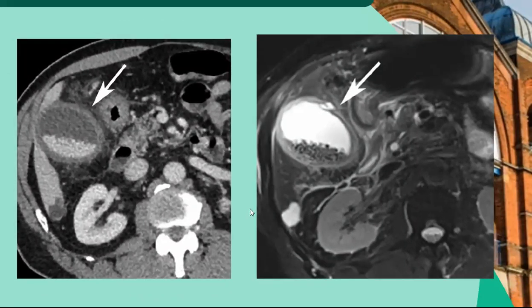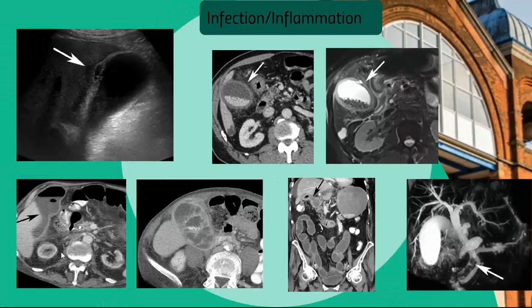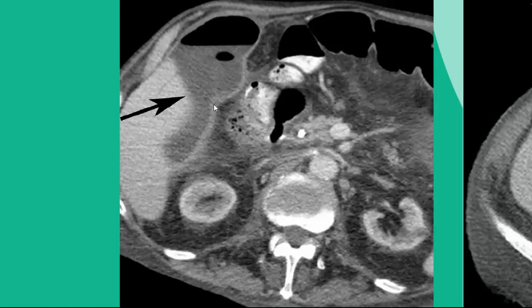Back to acute cholecystitis. This can be complicated by secondary infection of the inflamed gallbladder. Here we see emphysematous cholecystitis. This is where you have superinfection of the gallbladder by a gas-forming organism, and there's eventually a perforation of the gallbladder wall, and here is a collection with gas in it anterior to it. This is the remnant of the gallbladder. It affects diabetics and patients over 40 years old.